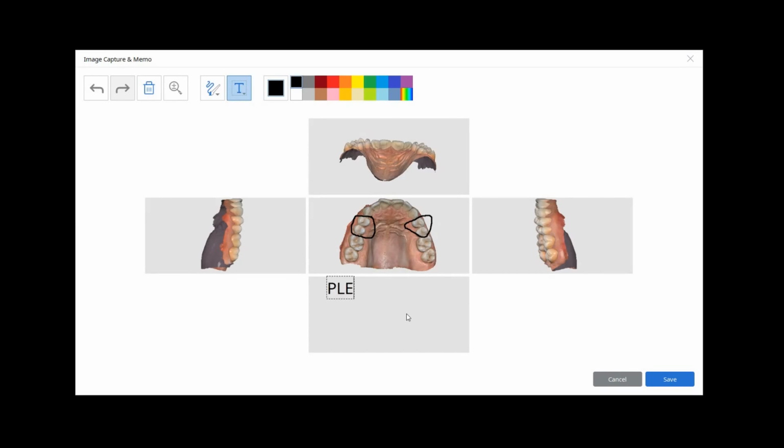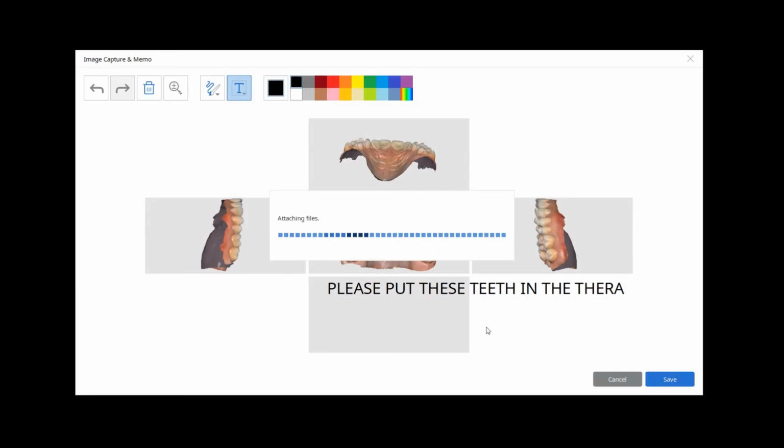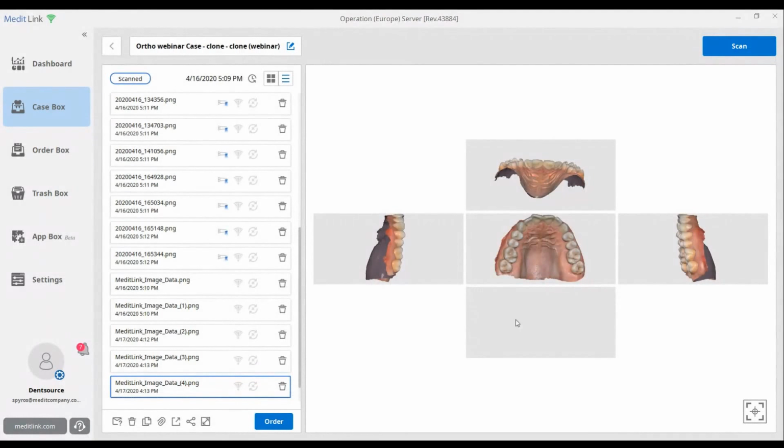just a second to change the languages. Okay, sorry, I can go. Okay, yes, in the here. So you can click save, and now, as you can see, it appears again with a message, so your lab can receive any information that they have. There is no information that they will miss from this point of view.